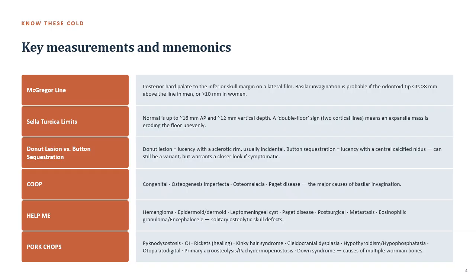When we're talking about a skull defect overall, we're talking about an abnormal area or a hole in the skull. Let's leave it at that.